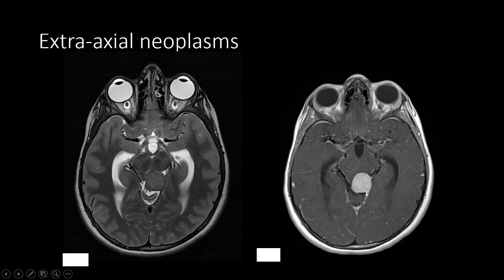So this is a pediatric patient with an extraaxial dural-based mass avidly enhancing along the left cerebellar tentorium. There is a dural tail. The mass severely compresses the cerebral aqueduct and causes obstructive hydrocephalus. Really, I think there's no way to distinguish this, which turned out to be a solitary fibrous tumor, from far more common meningioma. It's very difficult to distinguish from a meningioma preoperatively.